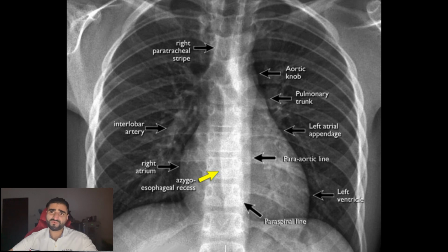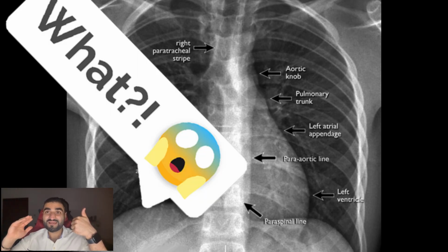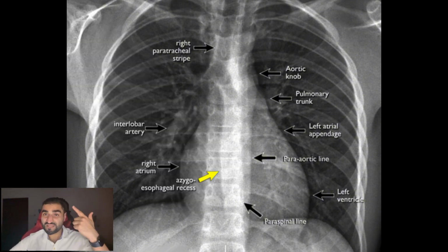So for the first part, we mentioned the identification. The identification is the most important part. You cannot be diagnosing patients if by mistake you have a different patient's x-ray there. So make sure you read the name of the patient, two or three names. Sometimes patients might have the same name as another patient. The second thing is that you have to make sure that the ID number is the same, depending on your hospital's protocol and your country's protocol.